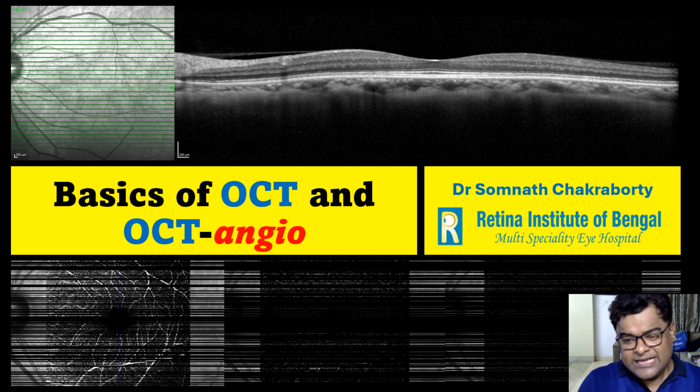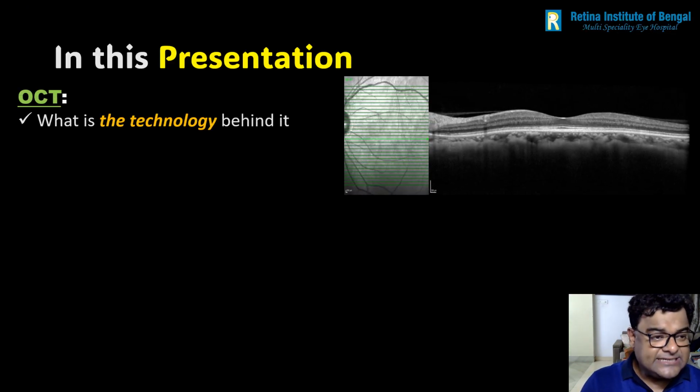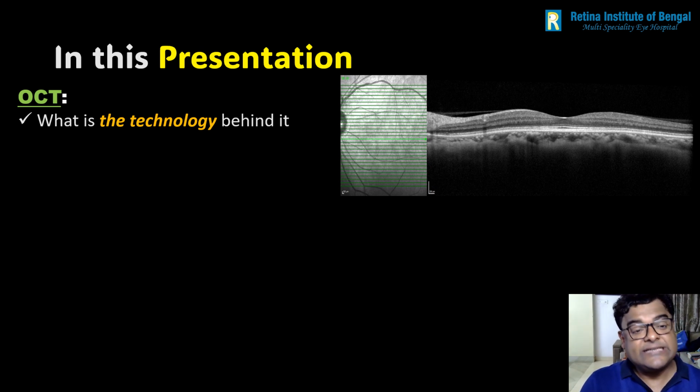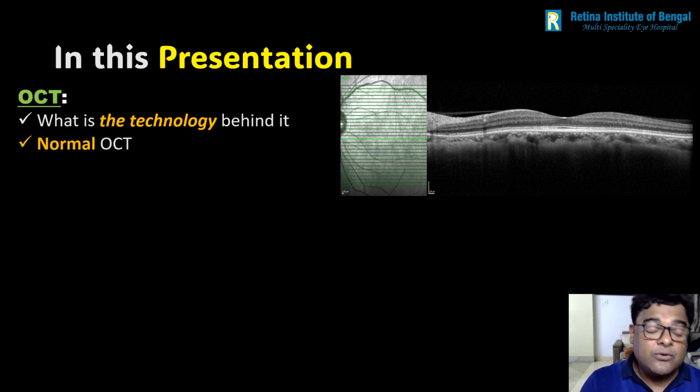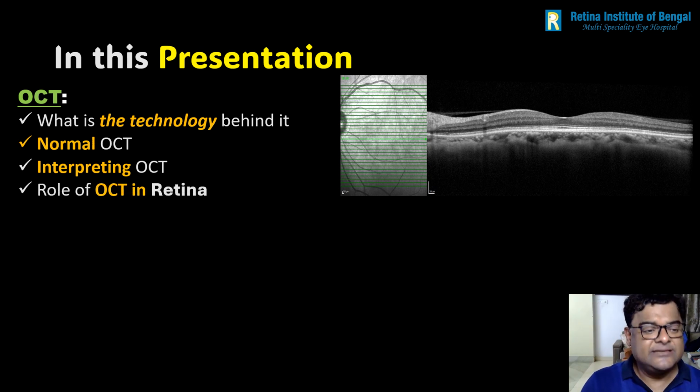Good morning. In this presentation, I will first discuss OCT. We will discuss what the technology behind it is, how a normal OCT looks. We will learn about interpreting OCT and then see what the roles of OCT are in a daily retina clinic.